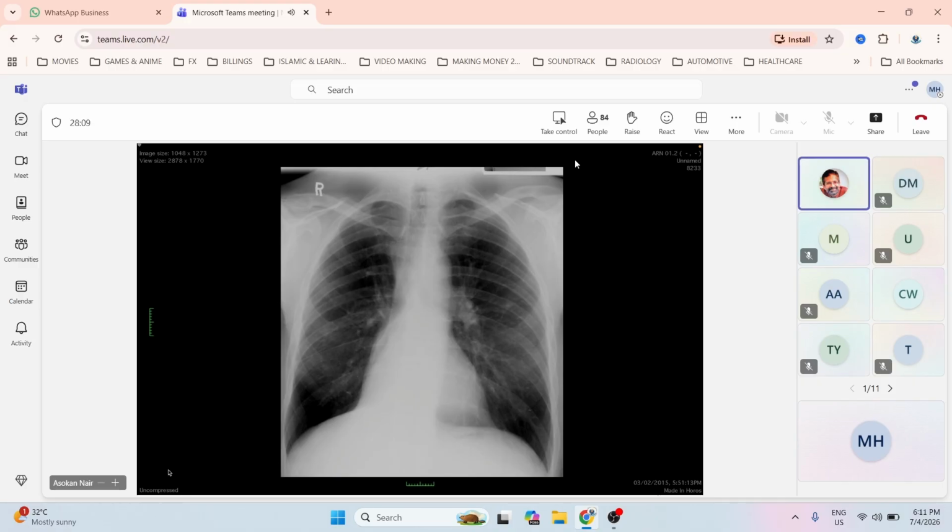And what do you think the patient will benefit from besides that? And what do you think the clinician will do? Bronchoscopic biopsy. Yes, okay. So the patient will benefit from a contrast enhanced CT of the chest and bronchoscopy. So on the enhanced CT of the chest, if we see a mass lesion, we then need a bronchoscopy to get the biopsy. Right? Okay. So this is a typical lower lobe collapse.